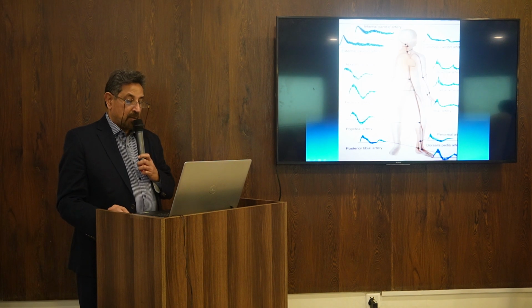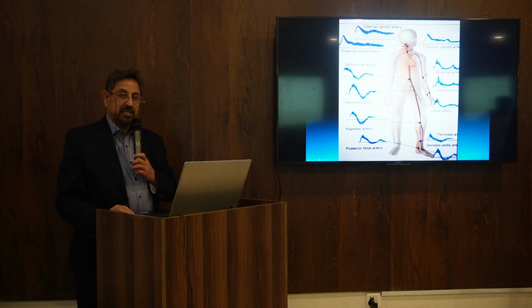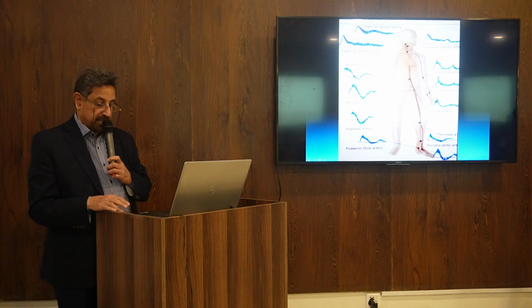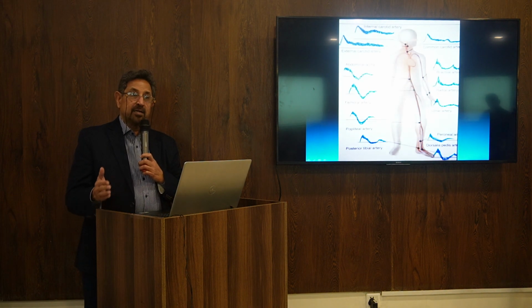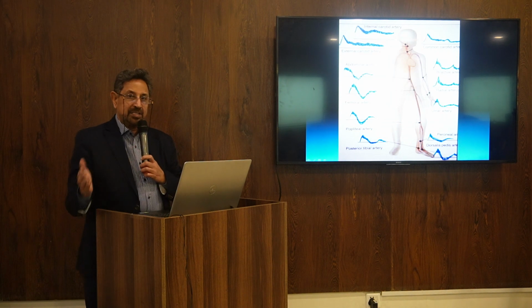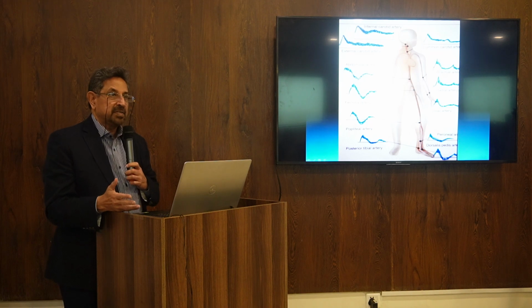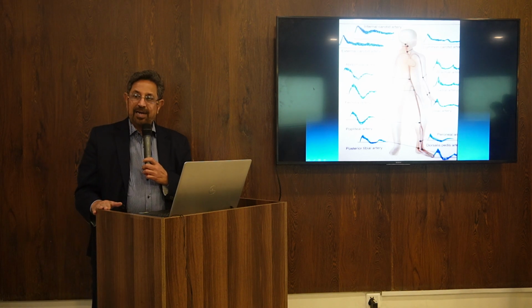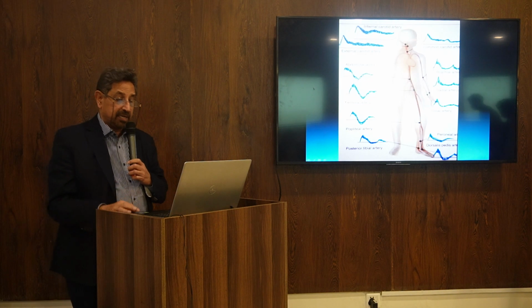So this Doppler signature, you must know these, and wherever these are changed, a good Doppler specialist or good clinician will immediately come to know what the disease is, whether it's proximal disease or distal disease. We'll come to that. What happens to the spectrum if disease is upstairs? And what happens to the spectrum if disease is downstairs? We can diagnose that immediately.